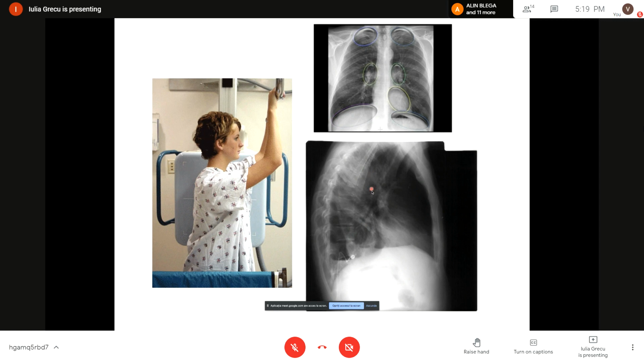This is very useful because now we can see very clearly around the hilum, the hidden areas of the pulmonary hilum. We can see what's behind the heart opacity, because we can perfectly delineate all this happening on the lateral view.